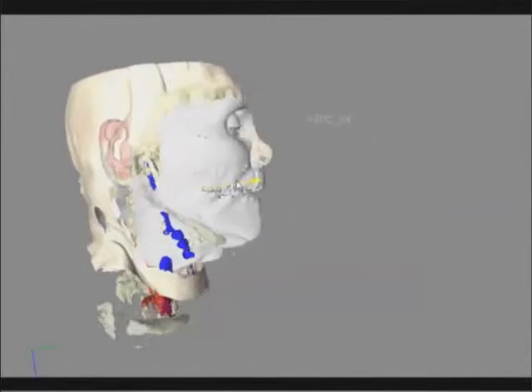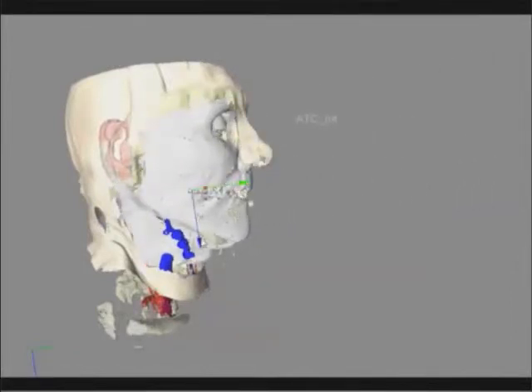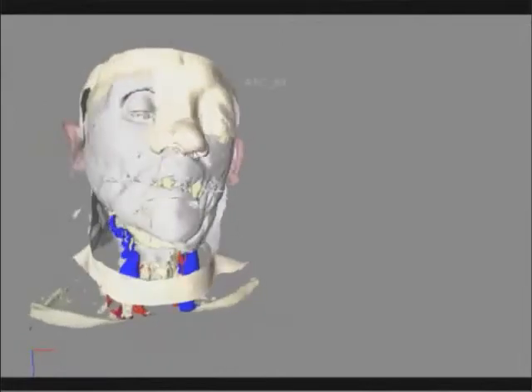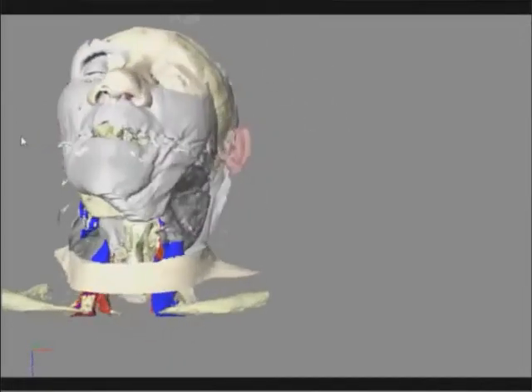We made more simulations. Here you can see number 4, where despite the fact that the structure was not absolutely perfect, the size and morphology of the soft tissue to be grafted were indeed adequate for the patient.